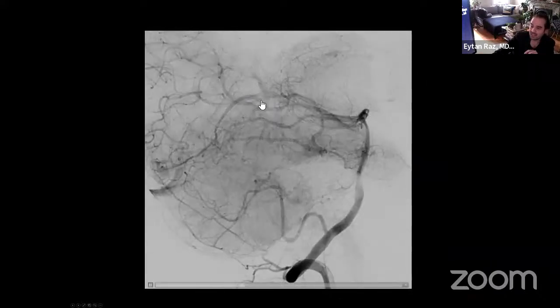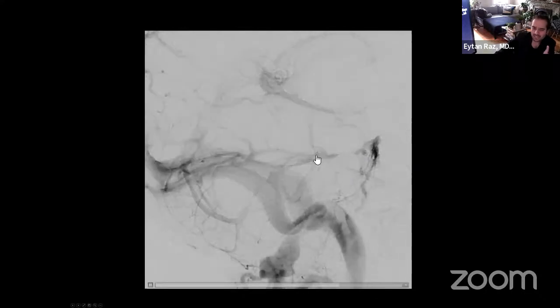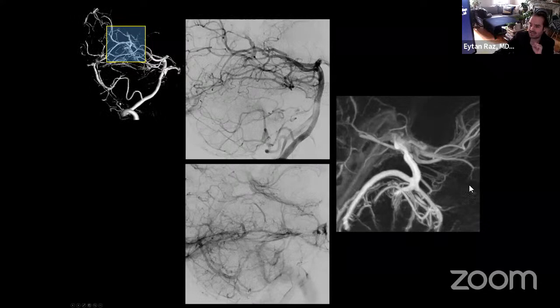So keep in mind how is the flow, and this is the run, right? That shows again the early venous outflow there, and now you start seeing another vein there. But what's the relationship between the two? That's what the DynaCT will tell you, okay? This is an early arterial phase. This is sort of a normal venous phase.